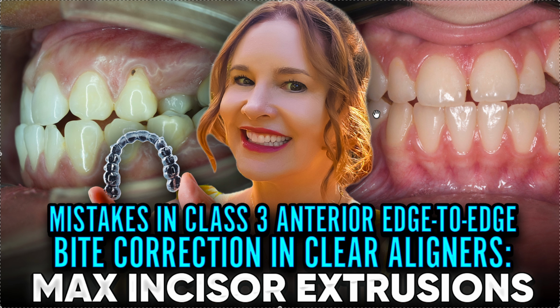But what happens is that a lot of y'all are like, oh, let's see if I can do this without IPR. Not thinking, well, click the bolt-ons in, look at the angle and the sagittal position. No, you can't. So what happens is when you don't specifically tell the techs you want to use only IPR to fix this, or a lower incisor extraction, but that would be for a much more severe case.